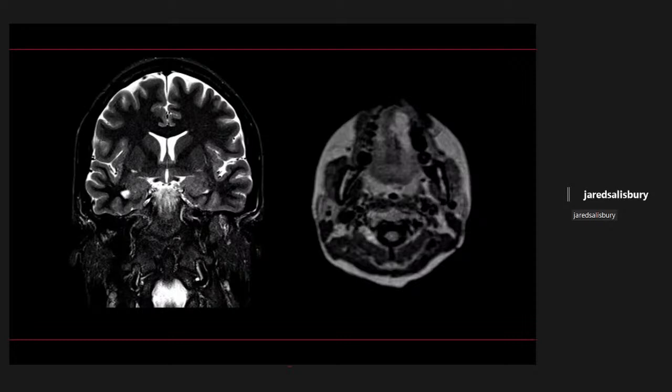All right. Yeah, both of the hippocampi look a little bit more architectural distortion to me. Yeah, and maybe part of that is that we are actually anterior to the hippocampi. Okay. So for anterior to the hippocampi, is that kind of where the amygdala also lives?